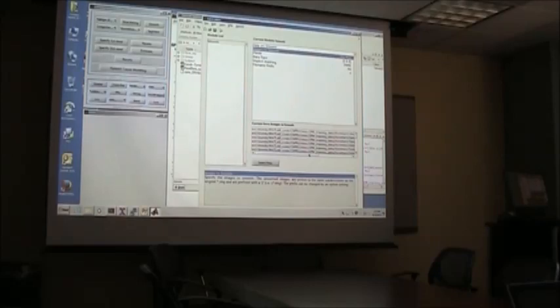What you will do is load up a set of images, in this case all the images that are done up till the previous pre-processing steps.